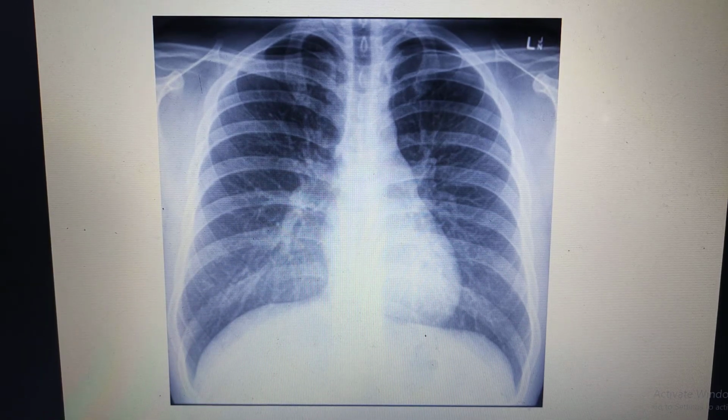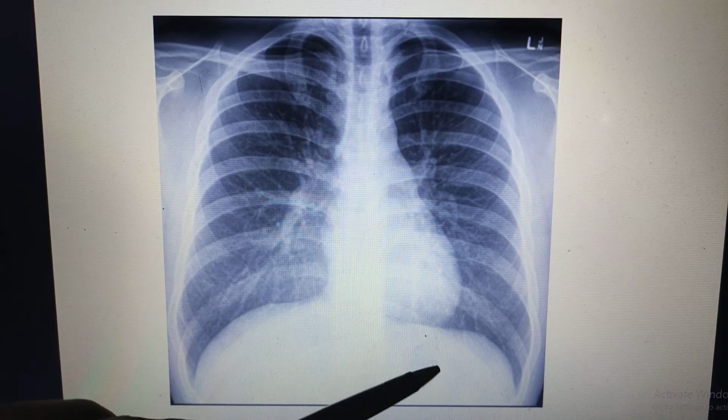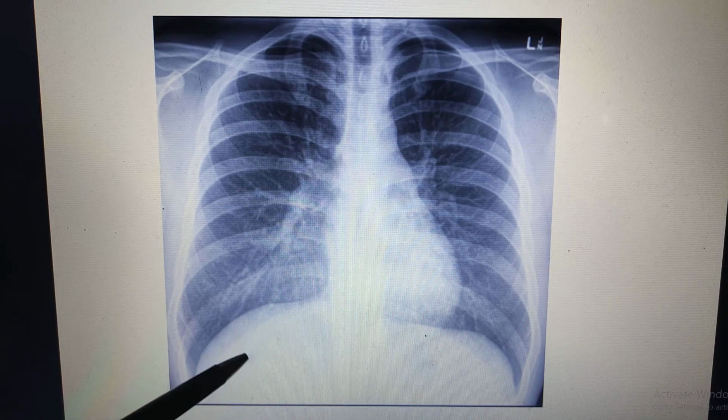After this, you have to look at the gas here. Here you can see some amount of gas, and many people will have gas here because you have the stomach. But remember, you are not supposed to have gas here. If you have gas here, it's a problem, right?